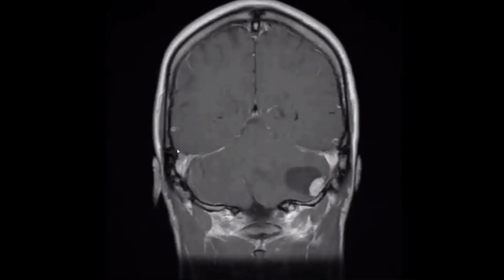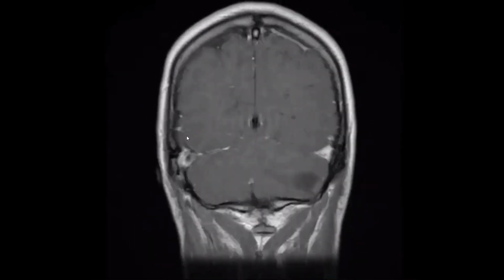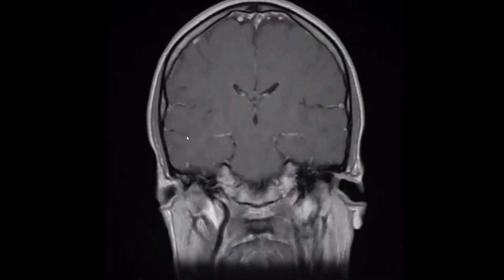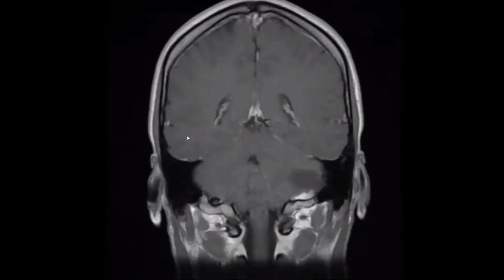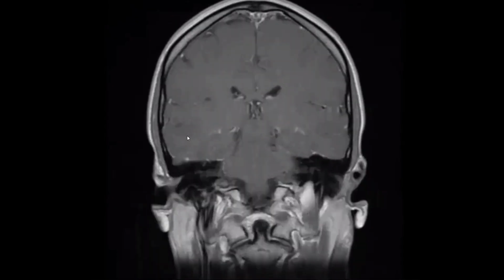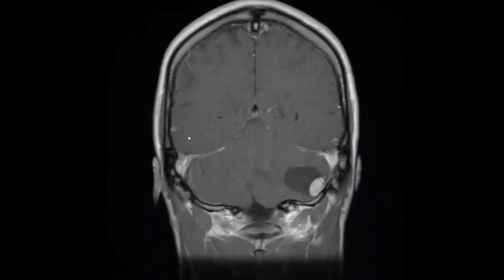Post-contrast series in coronal showing intense contrast enhancement with no other lesions. There is no multilocularity or multicentricity. It is a single lesion. We also don't have significant hydrocephalic changes. Do you agree? Okay. Yes. So we have an intracerebellar or intraaxial cystic space-occupying lesion with an eccentric enhancing nodular solid component.